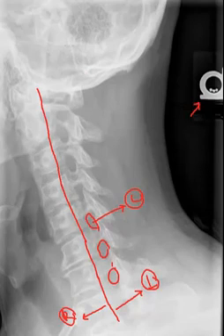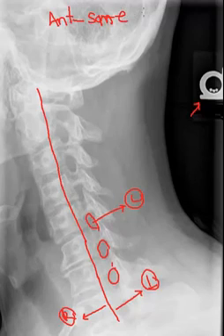If we remember that anterior obliques show us the same side IVFs, in the cervical spine at least, because when we get to the lumbar spine this is not true. Posterior obliques, cervical spine, please excuse me, show you the opposite side, or the contralateral side, IVFs.